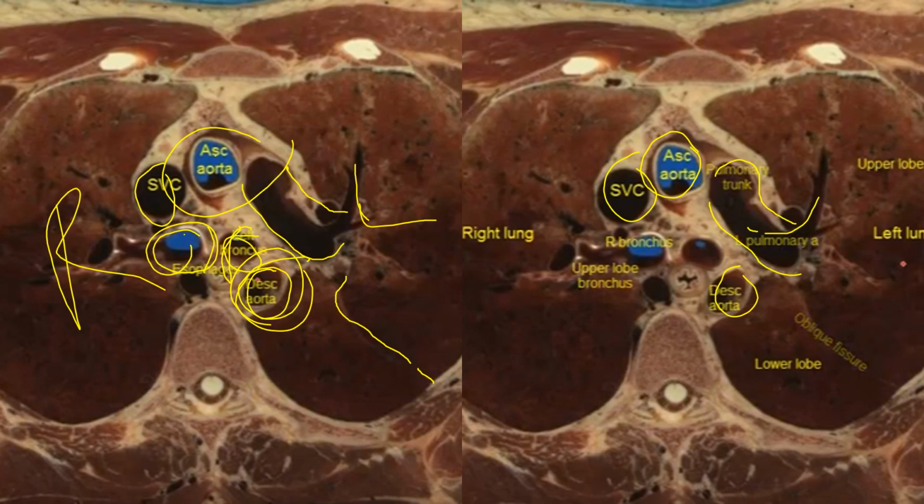And over here, on the screen on your right, you can see they actually talk about it there too. They label it there for you. So here, anteriorly, or according to this picture, superiorly, is the upper lobe. And anything below this oblique fissure is the lower lobe. So now you see the left upper lobe and the left lower lobe. So you're seeing segments here go into the lobe.